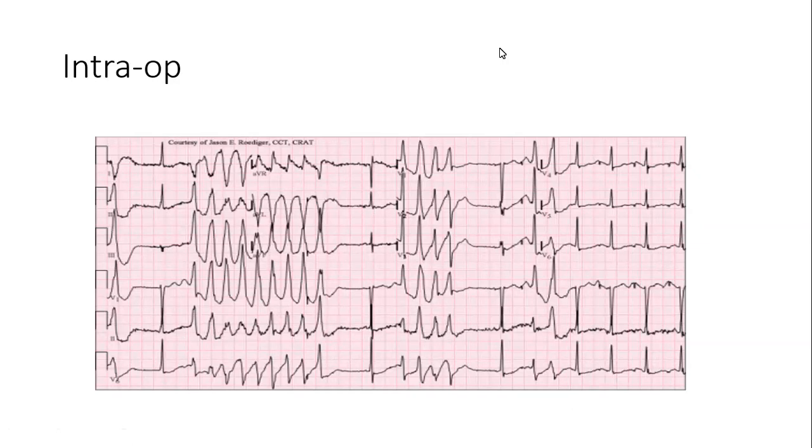Is it not a ventricular fibrillation? Okay, let's explore that. Why do you think it's a ventricular fibrillation? Because on almost all the leads, there's like a saw kind of appearance.